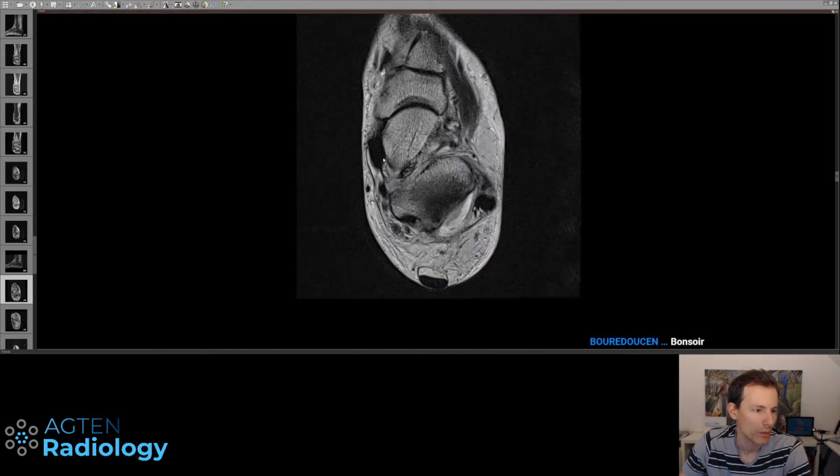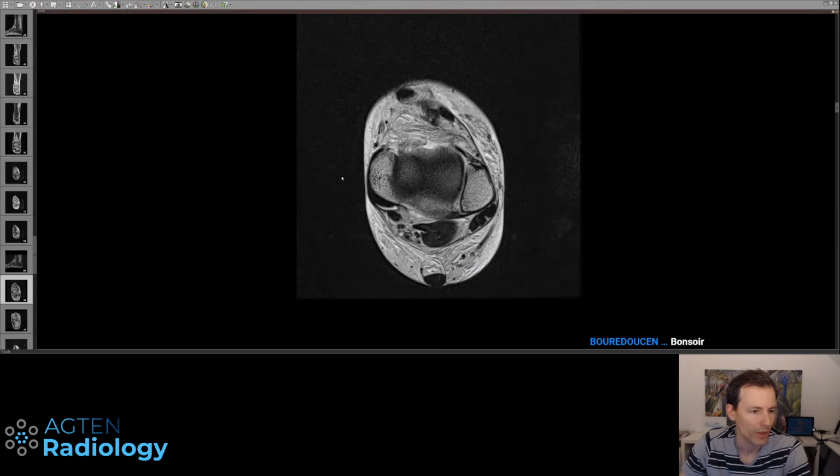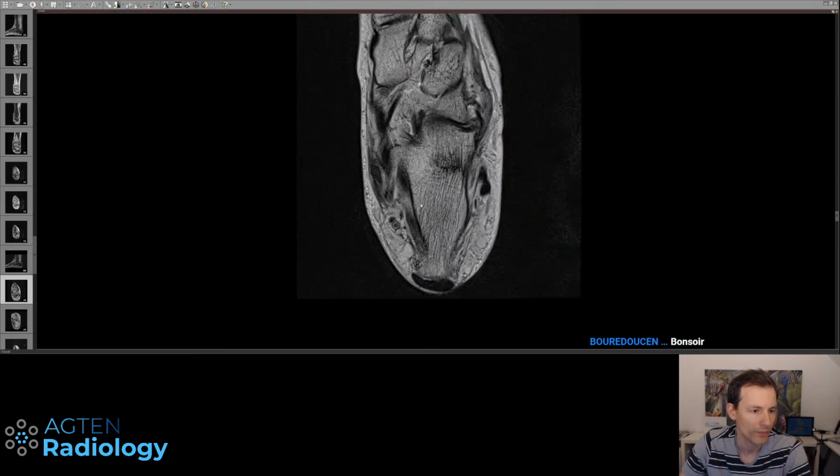Whilst at the medial ligament, always give a look at the spring ligament, and you can just scroll down to the calcaneus where you have this 90-degree notch here. This is where you have the origin of the medioplantar oblique and the inferoplantar longitudinal portion, which don't matter, so I just give them a look, but they are basically not important anyway.